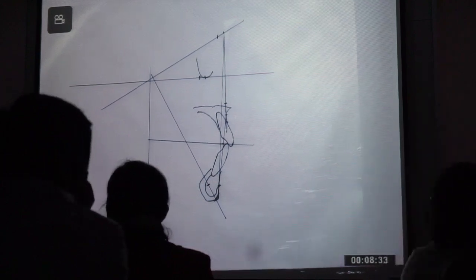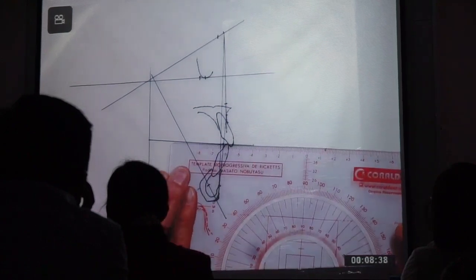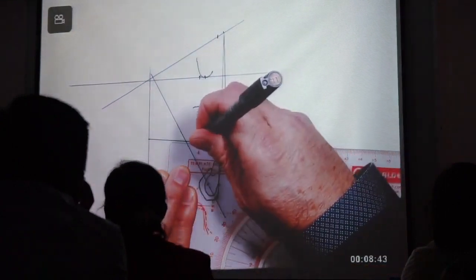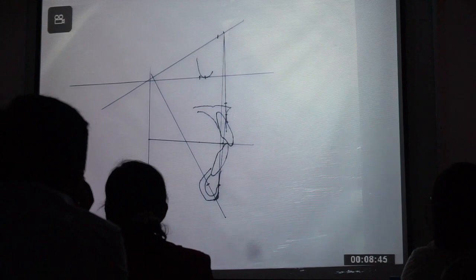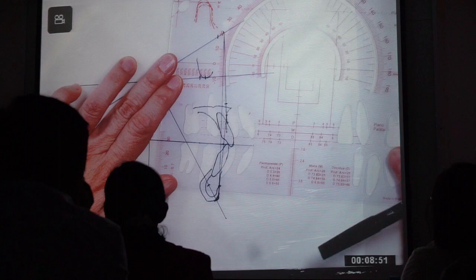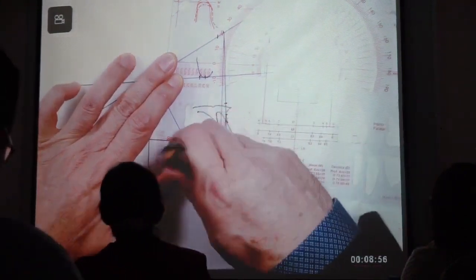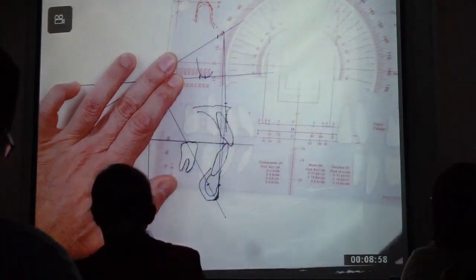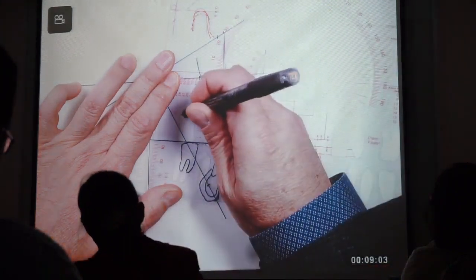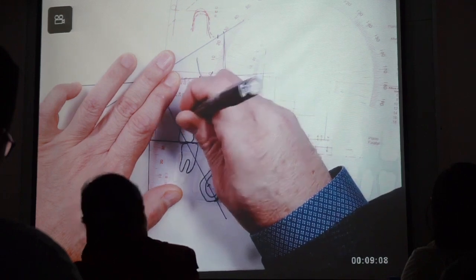Normally it's very close to 20 millimeters. So I put this in the border, in the edge of the lower, and I do a mark here, 20 millimeters backward. Then here I put the lower molar. This is a class 1. If it's a class 1, I put the upper molar in class 1. So this is the way I perform the VTO.